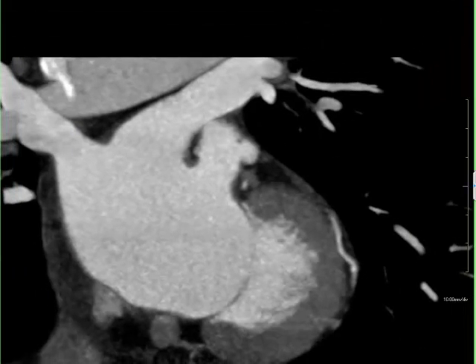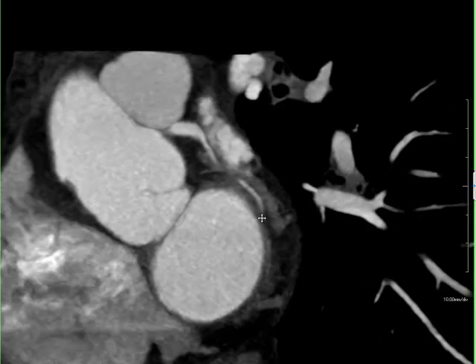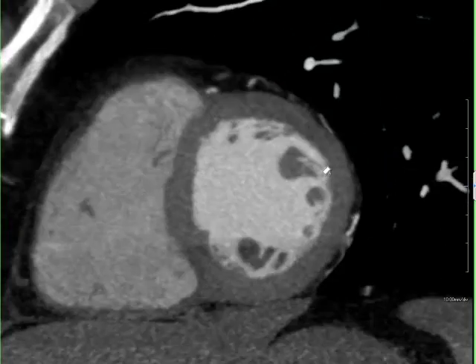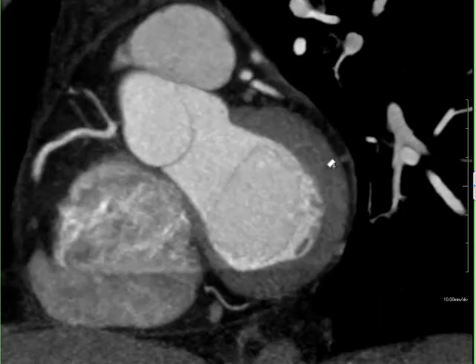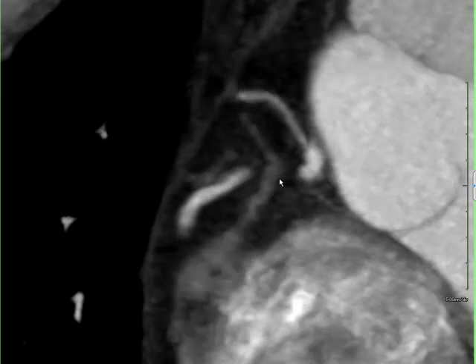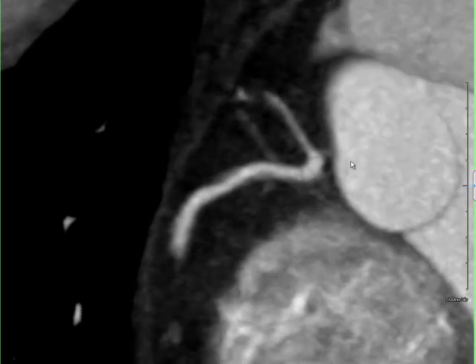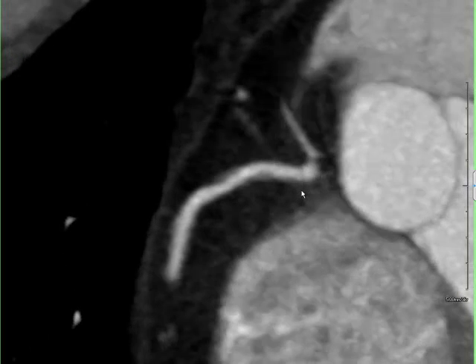The right coronary is best visualized by going into the anterior view and then rotating the heart into essentially an LAO caudal view, which brings out the circumferential vessels of the heart. And here we can see the right coronary coming into view. And of note, there is some evidence of, again, some non-calcified and non-obstructive plaque, both inferior and superior segment of this proximal right coronary. The ostium appears to be free of significant disease.